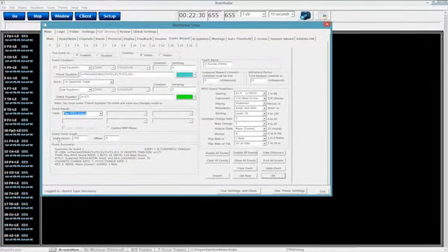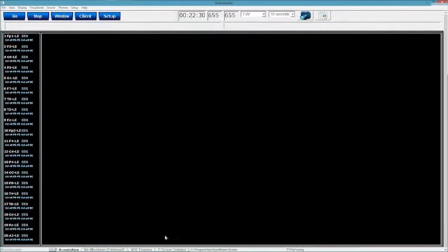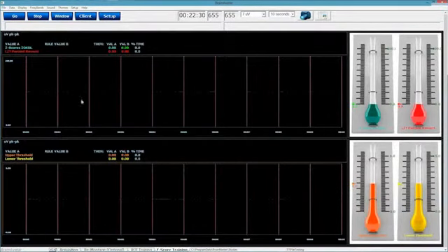The next section right here is our event trend graph. So we've got data coming in, and we're doing some different things that aren't the classic standard style of training. How am I going to view that? Everyone else has the standard graph, the standard screens, and all that. I know the thermometers. How do I view an event? Well, they created different screens, of course, called event trend graphs.